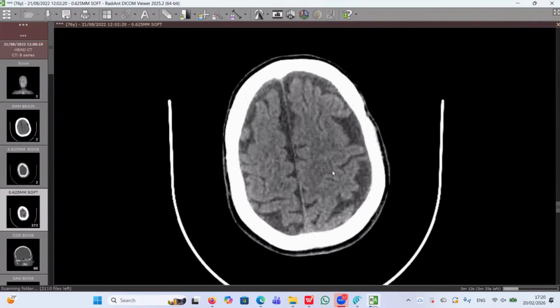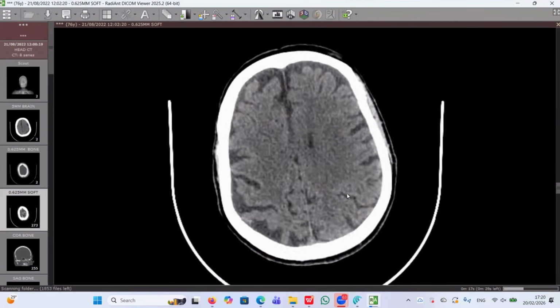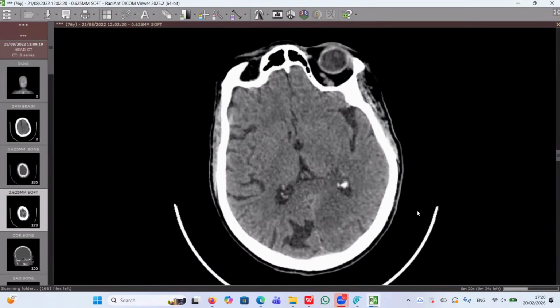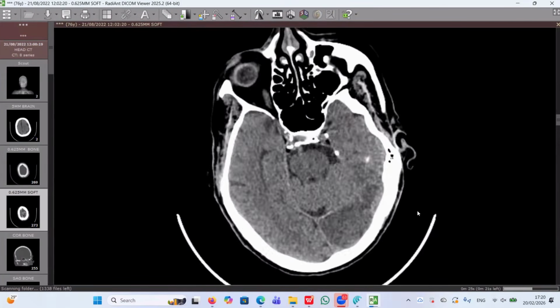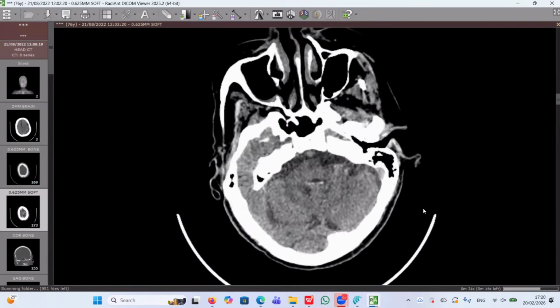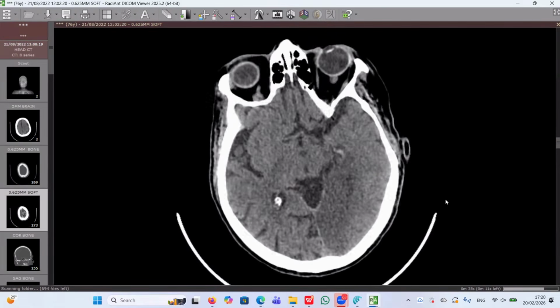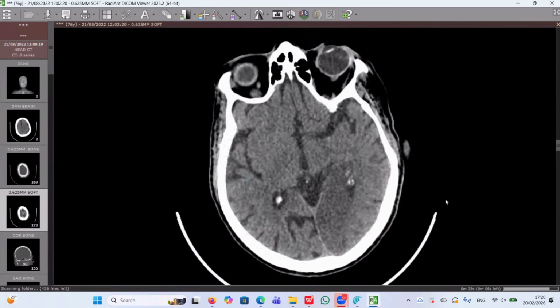This case came to me in the ER, complaining of acute vertigo. This is the CT scan brain non-contrast images. There is a hyperdense area noted in the left parieto-occipital lobe in a parasagittal location.